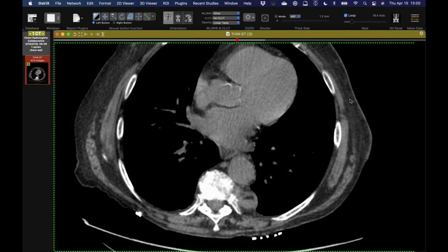Can I go back to our previous case for a second? The question of extramedullary hematopoiesis versus. Yep. Okay, when I've seen extramedullary hematopoiesis, it's not had the fatty component. Have you guys seen extramedullary hematopoiesis with this much fat? No. Yep, I have both with and without sometimes. Really? Okay. Because mine have been more solid, not showing the fatty stuff. I'll go back and look at all my cases. I'm sure I've saved all the ones we've shared over the years. And I don't see that many cases of it.